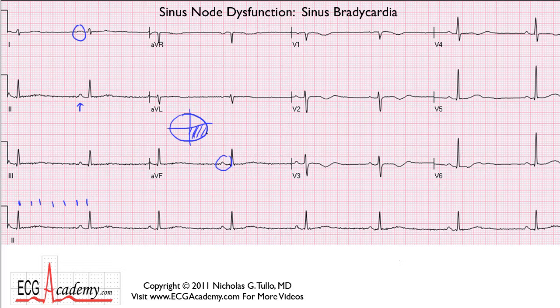So we know this is a sinus rhythm, and it's below 60 beats per minute, so we call it sinus bradycardia. Now, the PR interval looks at the upper limits of normal. I would have to call it about 180 to 200 milliseconds if you take calipers. Now, there is a little bit of noise in this EKG, but this course is designed to help you look past that noise and read real cardiograms, not just the ones drawn in a textbook.